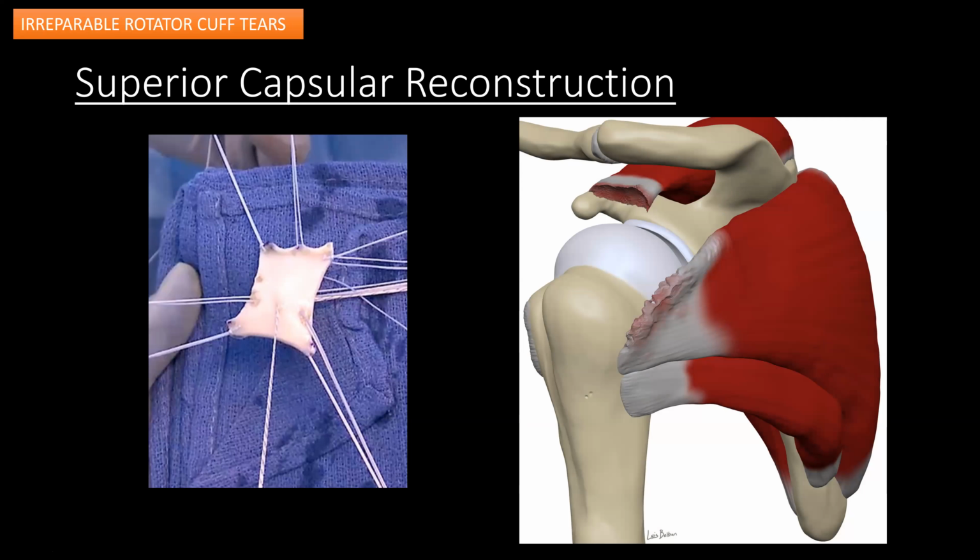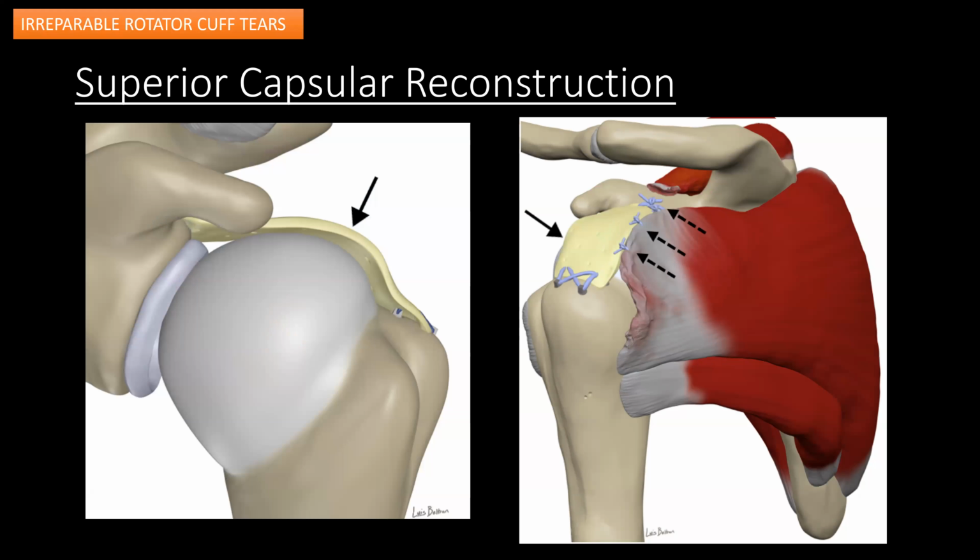They put in anchors. Usually the anchors on the glenoid side are at approximately the 10 o'clock and 2 o'clock positions of the graft on the clock face, and then anchors are placed in the greater tuberosity. At our institution, they do a double row, so you'll see two rows in the greater tuberosity. They shuttle the graft inside the body, and they put the anchors in the greater tuberosity and the superior glenoid.